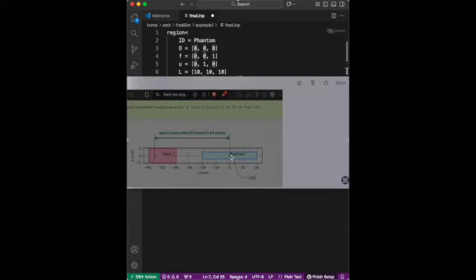So right now my phantom is sitting like this. When I say 0, 0, 0, that means the 3D cube entirely sits like this.